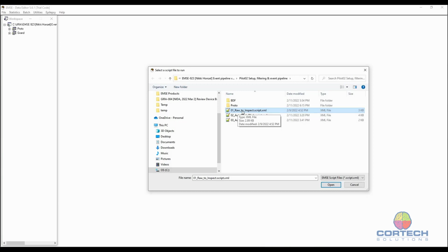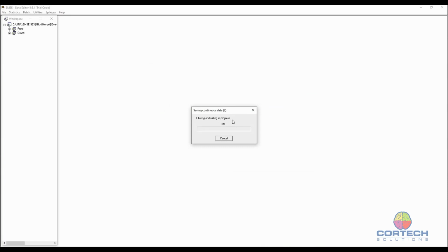for each individual, save that into a directory structure, which we'll see, sorting them out participant by participant, and putting that in the workspace. So it's just kind of setting it up. So I'm just going to double click on this, and we'll give it a little time. If you see this, it says not responding. That's just because EMSE is working away.